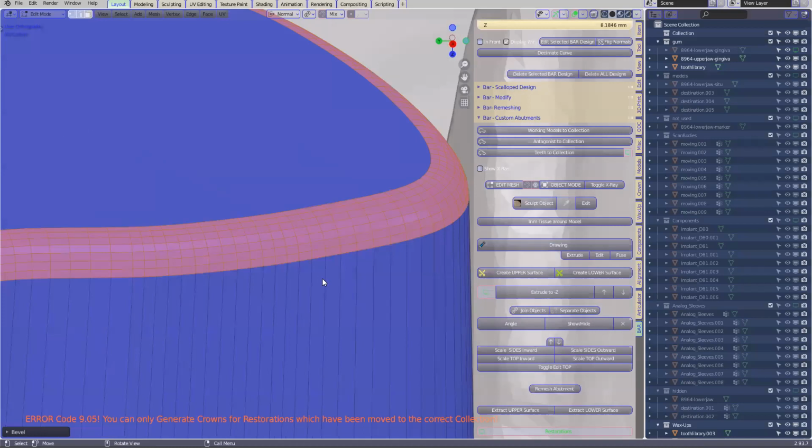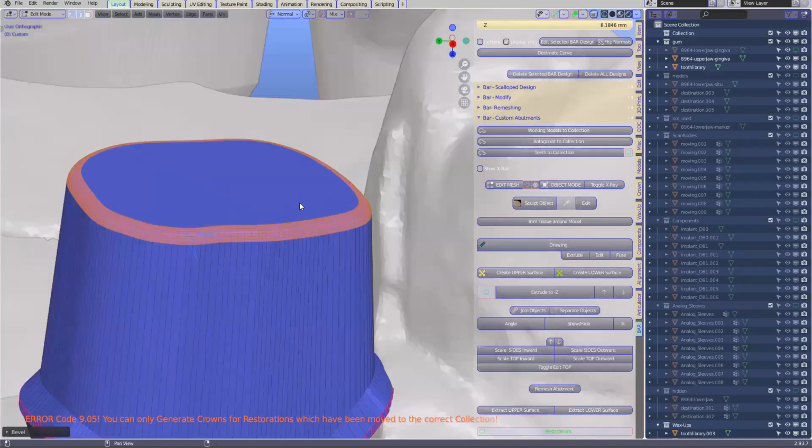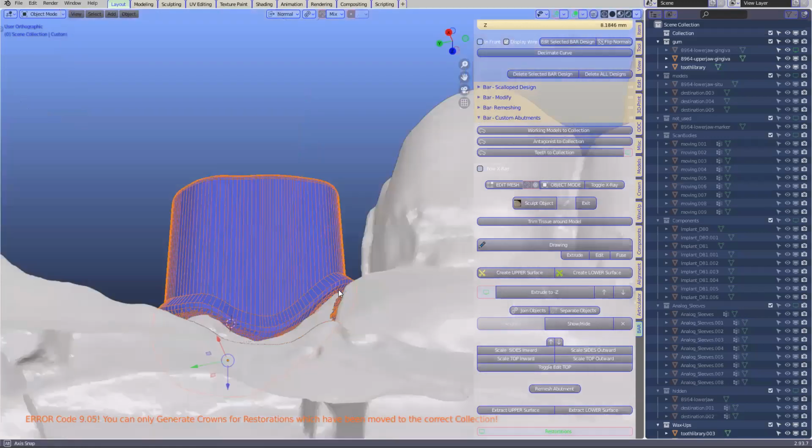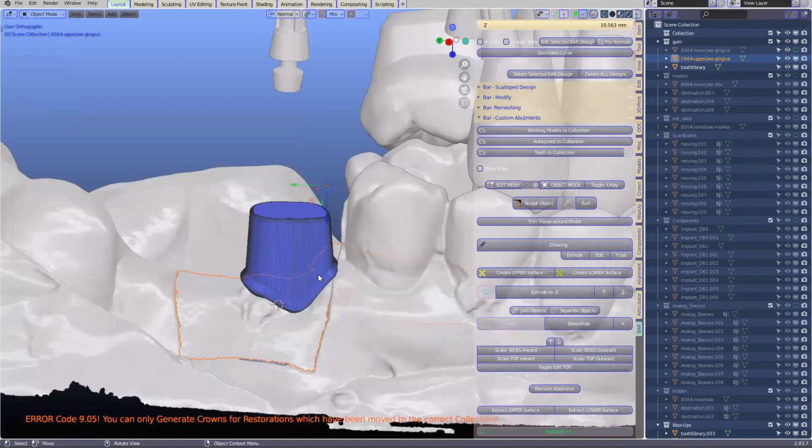Next thing we want to do is remesh it. This is a very, very important thing that we have to do. It uses my algorithm to remesh it. It's not using anything else. The other thing we need to be careful of is that we don't want this to go downhill like this, because we know that these banks don't go down.